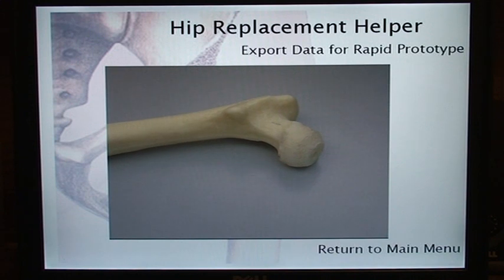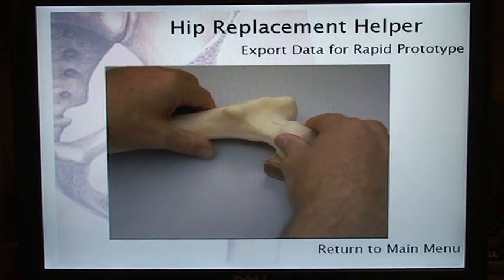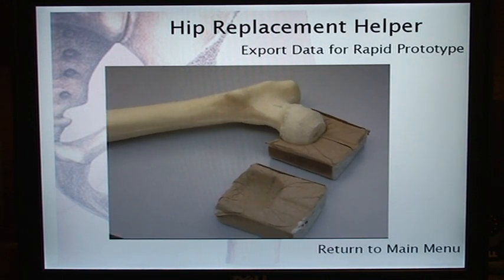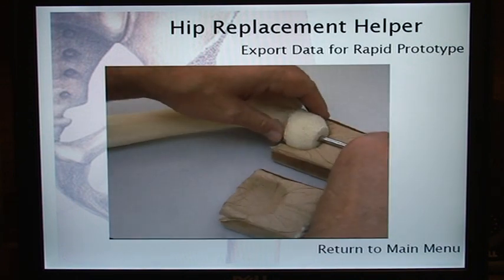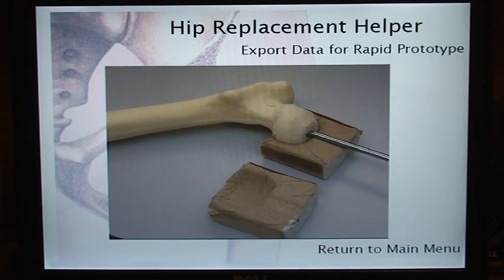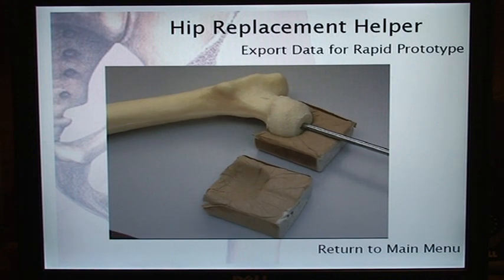With this STL file, the Rapid Prototyping Machine software will then generate two negative images of the femoral head. Next, a pilot hole will be added to the images, resulting in an anatomically correct mold of the femoral head with a tool guide hole. With the mold design finalized, the Rapid Prototyping Machine can then create the molds for use by the surgeon.